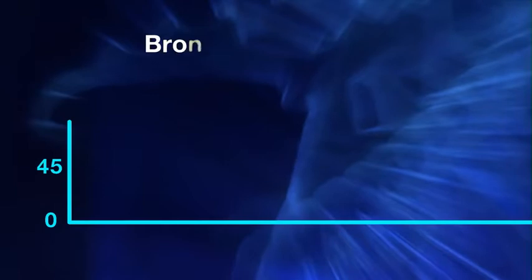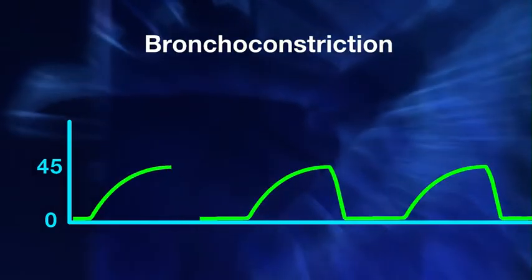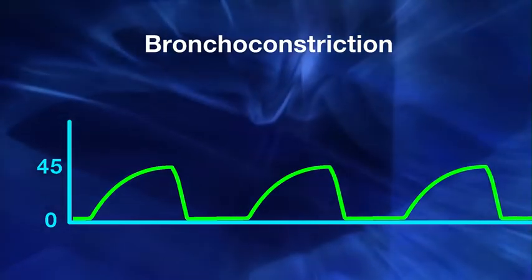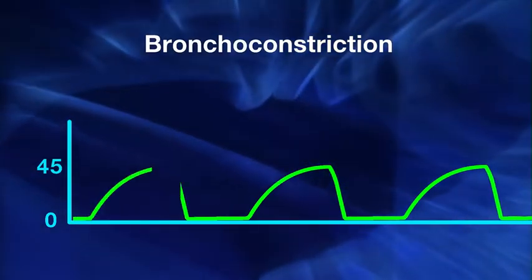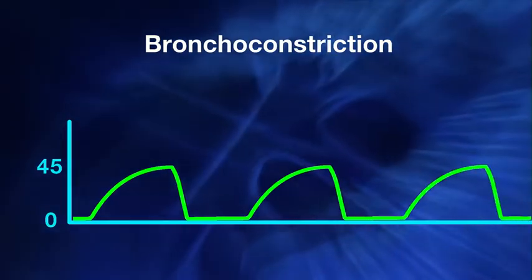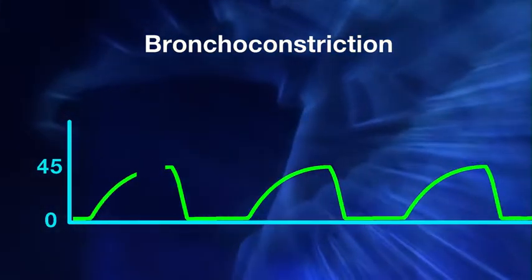The characteristic waveform pattern for bronchoconstriction is a shark fin shape. When bronchospasm hampers ventilation, there is a curved upstroke of phase 2 with a more pronounced angle to phase 3. Again, there is a prolonged exhalation phase.